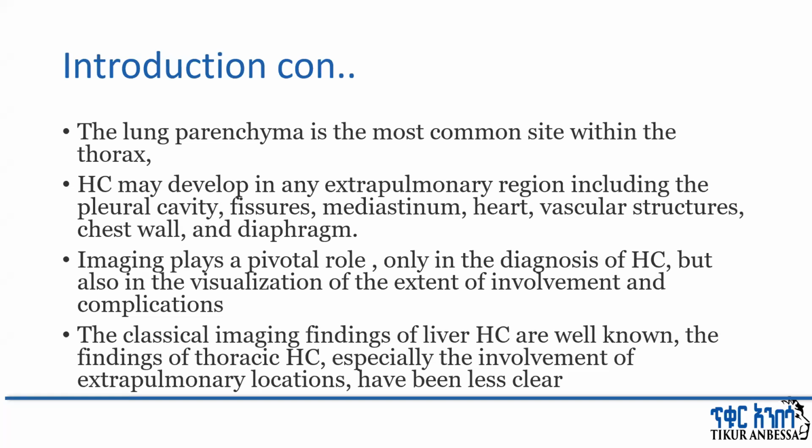Lung parenchyma is the most common site within the thorax. Hydatid cyst may develop in any extrapulmonary region, including the pleural cavity, fissure, mediastinum, heart, vascular structures, chest wall, and the diaphragm. We will cover each. I have example images to show you in each part. Imaging plays a pivotal role in diagnosis, and also in visualization of the extent of involvement and complications associated with the hydatid cyst.